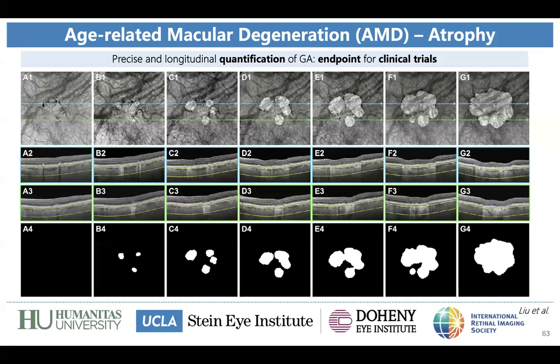And this is important in the context of drusen. For example, I showed you that calcified drusen can have a donut pattern, but then when they become atrophic, they become a very round hyperreflective and hypertransmission defect. In this case, there was a donut lesion corresponding to a calcified drusen in the past, but now we are only visualizing the atrophy.